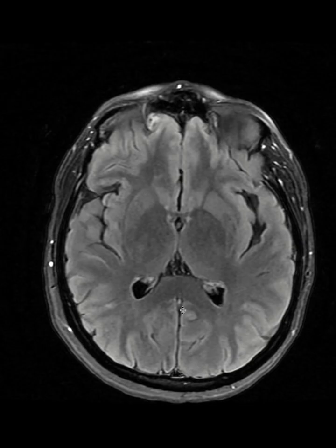So just get familiar, because in radiology, one of the things that I realized over some years of practicing is that it's very important to always think out of the box. Don't just look at what diagnosis the patient was sent to you with. It's very important to use your knowledge, use what you are seeing in the imaging, and find other explanations for the patient's symptoms. So this patient came to me, for instance, for headache, but I don't see anything that explains the headache. This is not an imaging feature of migraine headache.